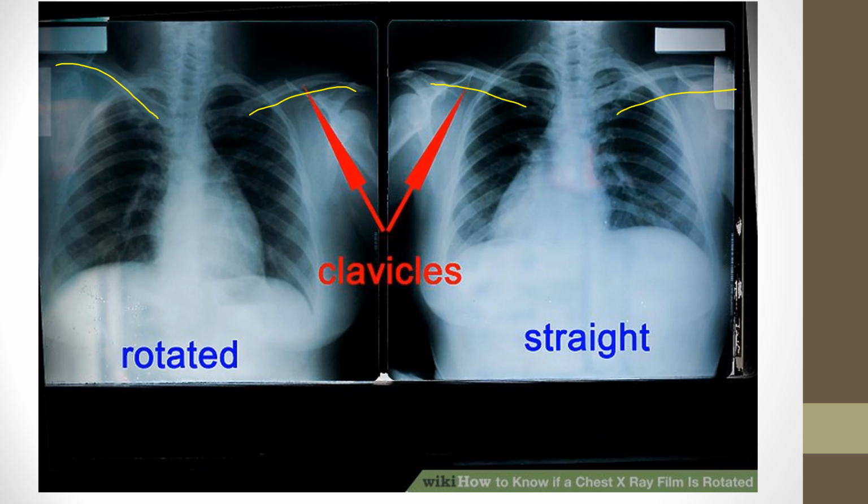And then not only that, but you can see the vertebral bodies. You can see the tracheal shadow is pretty straight. Now I can't draw straight, but it's pretty straight compared to over here. You see the trachea is actually deviated to one side too. So that's a big difference because of the rotation. That changes how we see things, especially when we're looking at things like lung volume. Especially look at this patient's right lung. Okay, big difference between 1 and 2, right? Big difference in the cardiac shadow, big difference, right?